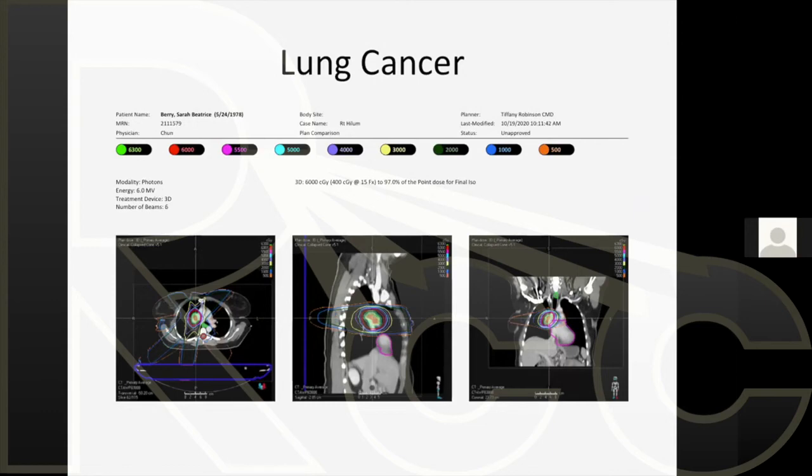So what are the differences? Let's look at it. What are the differences? And I want you guys to look at it. So here's one plan, very pretty. Here's another plan. So this is actually a 3D conformal plan, right? So what it is giving is beams at different angles. But you can see it's not as conformal as my VMAT plan is, right?